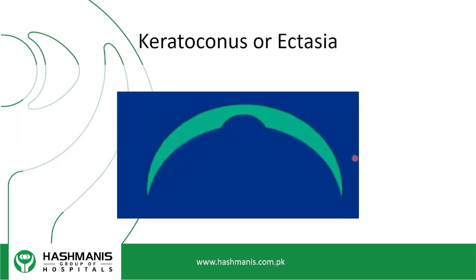We went through this, and then remember, keratoconus starts at the posterior surface. So again, we're talking about K readings, we're talking about anterior elevation. Remember, keratoconus starts at the posterior surface. So if you have K readings that are normal, it does not mean that you don't have a keratoconus cornea. It just means that the anterior surface is normal, so the cone hasn't gotten to the anterior surface. But when you do a Pentacam, or any topography, you can get posterior elevation, you can get progression that's out, and that would still mean that there's a biomechanical deficit in that particular person.